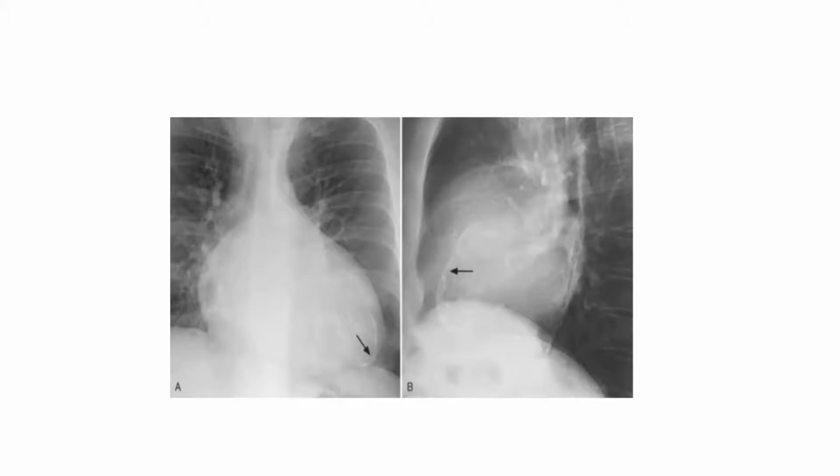And this is part of the aneurysmal apex remodeling. It thins out, it becomes fibrotic, and it might trap calcium and become calcified. So calcification of the aneurysm is the natural progression of an aneurysmal apex. It might get calcified to the extent that you can see it in the chest X-ray like this.